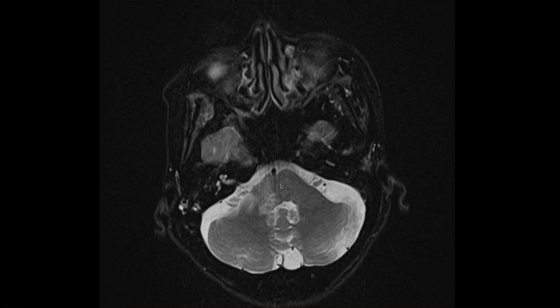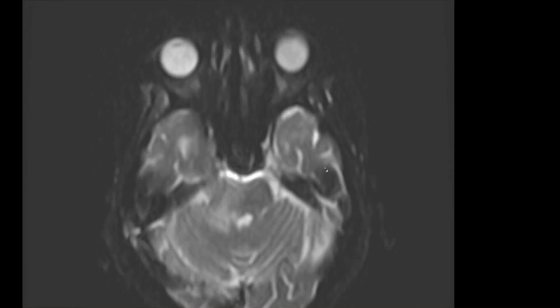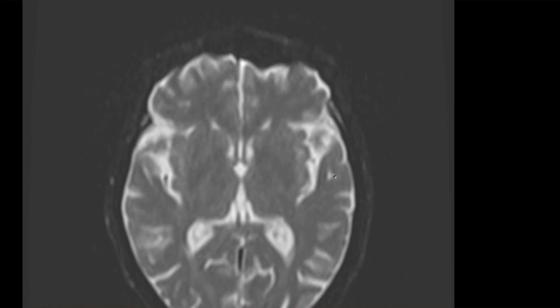So diffusion is very useful, though. There are a few other sequences that also look at diffusion through axons, like diffusion tensor imaging. Clinically, it's not really, to my knowledge, used outside of surgical planning. But you can actually use tensors to map each of these axons based on how water molecules are moving through those white matter tracts. So we're trying to use it in the spinal cord. Again, that's kind of experimental.